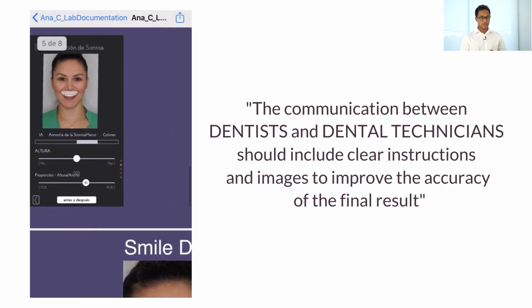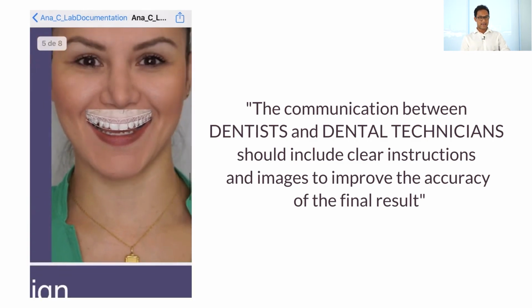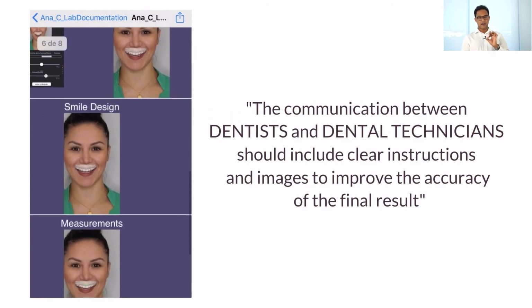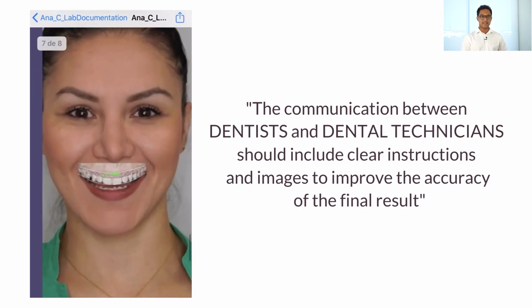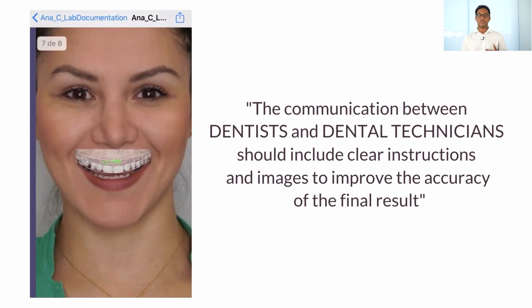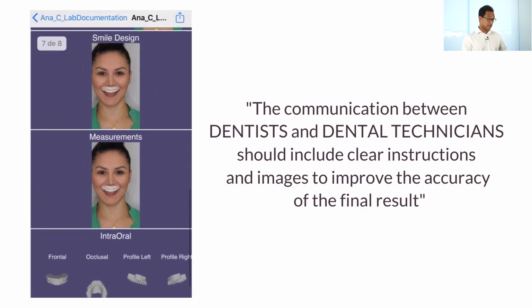And then you have, of course, pictures of the STL, but you also get the STL file. And that is a great way for you to communicate with other dentists and dental technicians, because you will be including clear instructions and images to improve the accuracy of the final result.